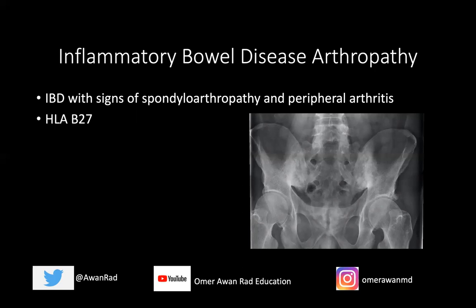This is an HLA-B27 seronegative spondyloarthropathy, just like ankylosing spondylitis is, just like chronic reactive arthritis is, just like psoriatic arthritis is. Now, all 4 of these things are clinically different, but radiographically, we typically talk about IBD arthropathy and ankylosing spondylitis being identical radiographically, and then psoriatic arthritis and chronic reactive arthritis being identical radiographically. Again, this is the bilateral symmetric sacroiliitis.